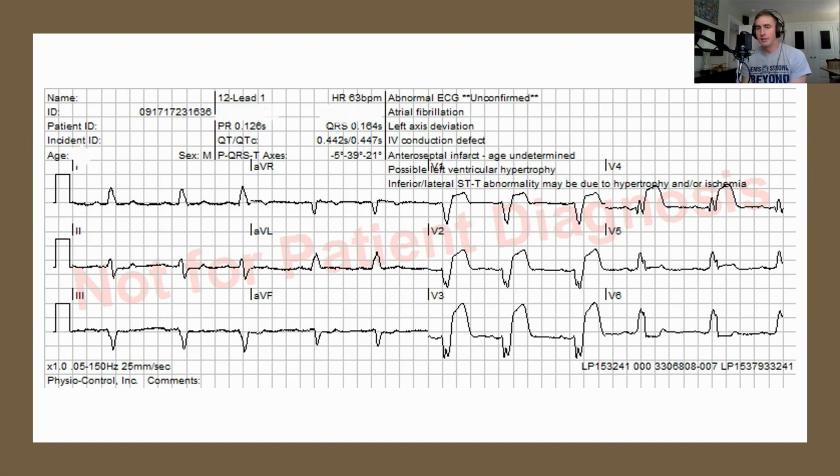Now, this paramedic thought that you couldn't diagnose a STEMI in the setting of a left bundle branch block, but she also thought that the EKG was definitely abnormal and erred on the side of caution and took the patient to a PCI center. Once they got to the PCI center, it was quite a while before the patient actually went to the cath lab because the physician read the EKG and thought that you couldn't diagnose a STEMI in a setting of a left bundle branch block and was looking for a previous EKG.